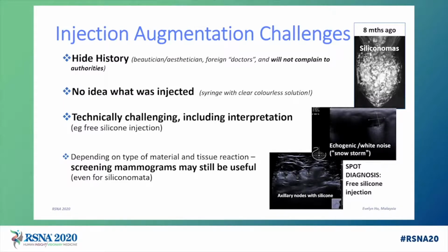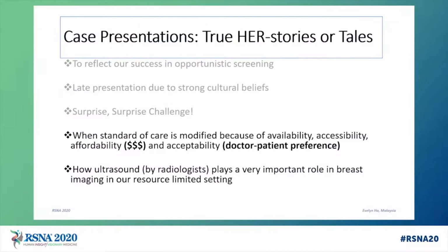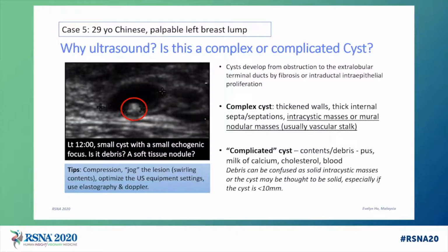My last breast imaging tale has a 15-year span. A 29-year-old Chinese lady had a left breast lump. Ultrasound was the first investigation of choice, as most young patients have either a lumpy texture but otherwise normal ultrasound scans. In this age group, benign lesions such as fibroadenomas or even cysts are far more common than cancers, and ultrasound is also far more acceptable. The most significant finding is presented.